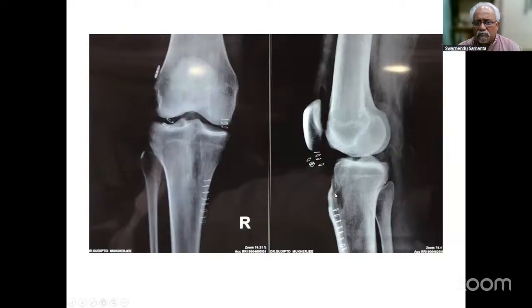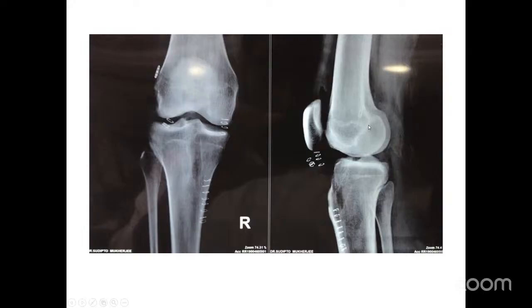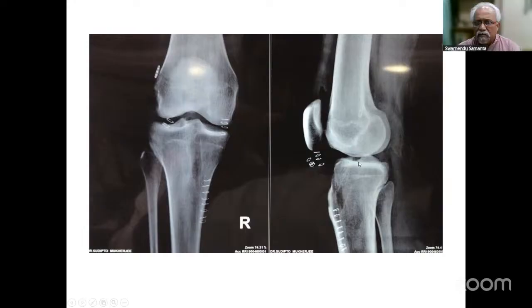Okay, can you see this mouse here? This is the anterior margin of the tibial tunnel, and this is the posterior margin of the tibial tunnel. So what you check is that this margin of the tibial tunnel has to be posterior to the Blumensaat line. Okay, this is the Blumensaat line. Understood? Yes, sir. So this is the Blumensaat line, so that the tibial tunnel has to be perfect.